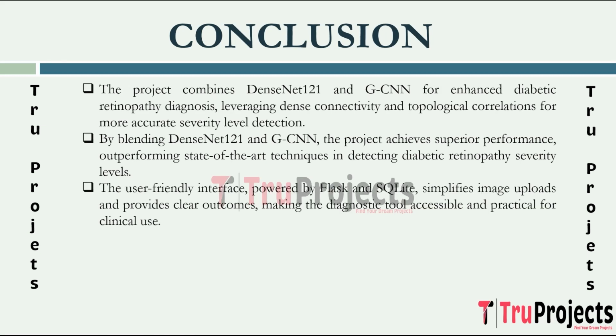The integration of the Flask framework with SQLite for user sign-up and sign-in, coupled with a user-friendly web interface, enhances the accessibility of the developed diagnostic tool. Users can conveniently upload images and the system provides clear outcomes, facilitating practical applications in clinical settings.